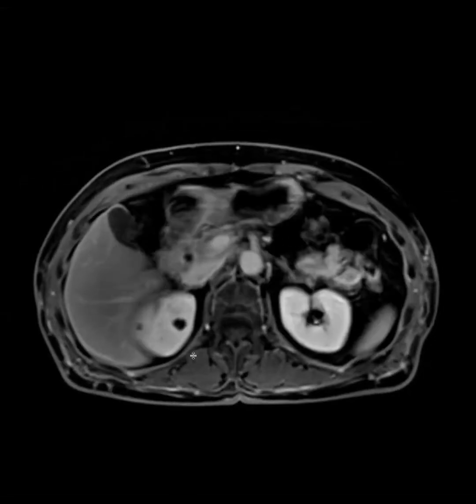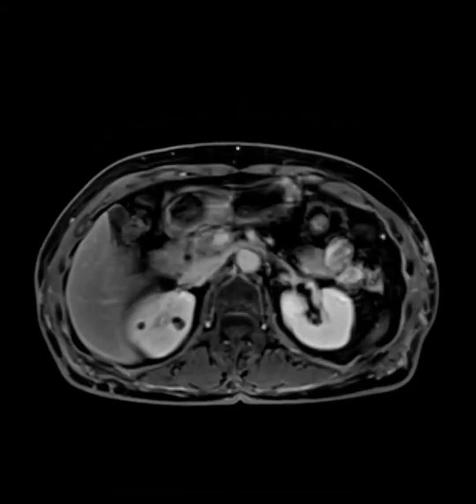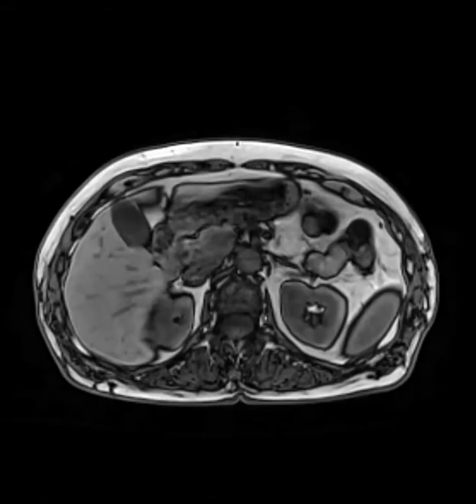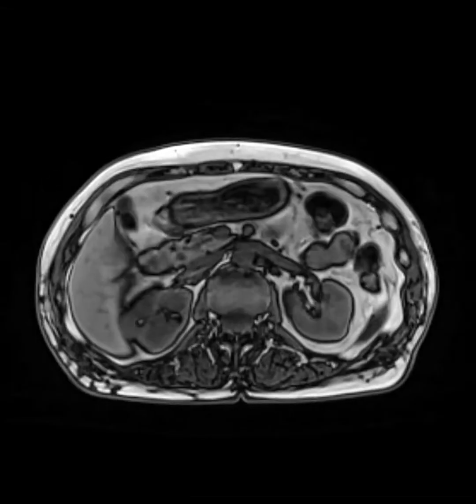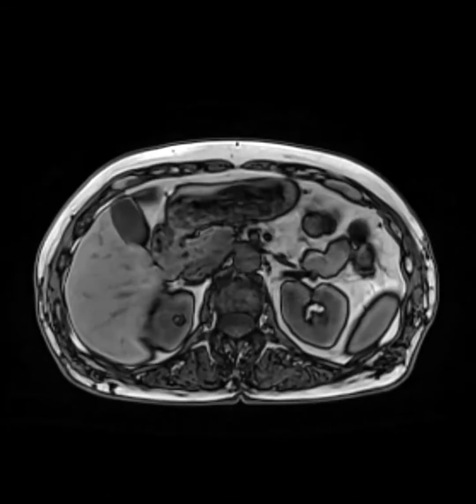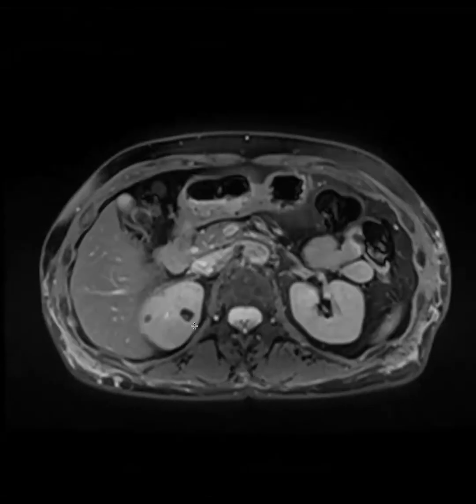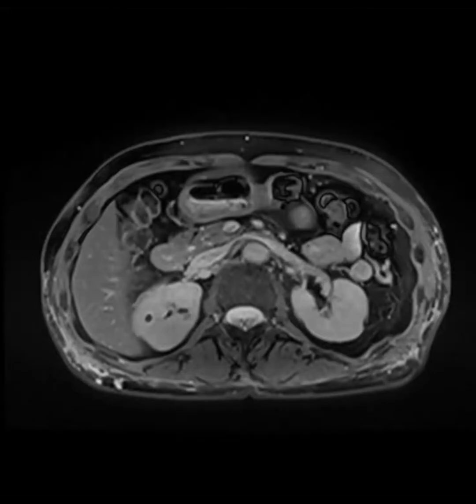T2 bright. Sorry, T2 bright and really T1 dark, like a lot of susceptibility or something. On the pre-contrast, wasn't it really dark? Oh, an AML. Yes. Great. And here are the fat-sat sequences, or here's SSFP, and then I have the T2 fat set as well, which shows the same thing.